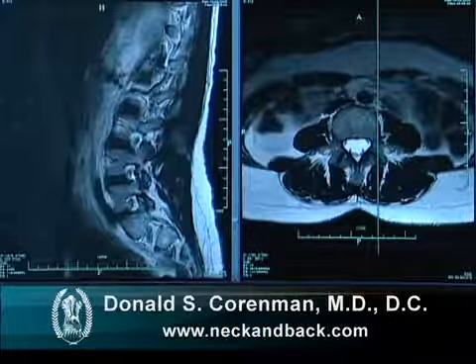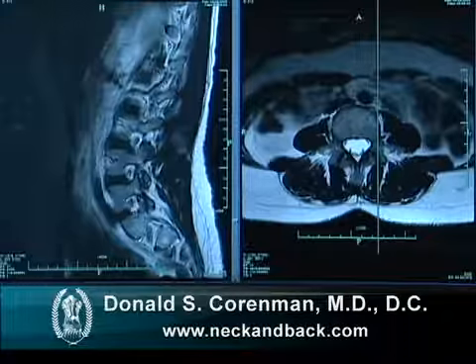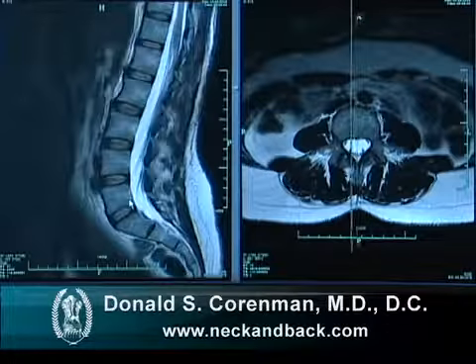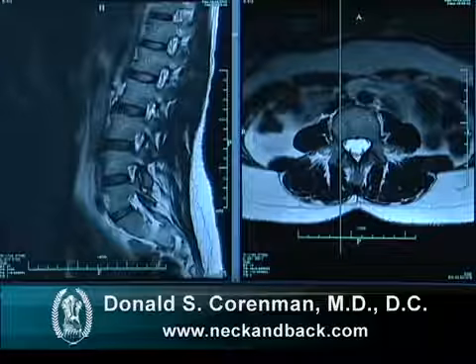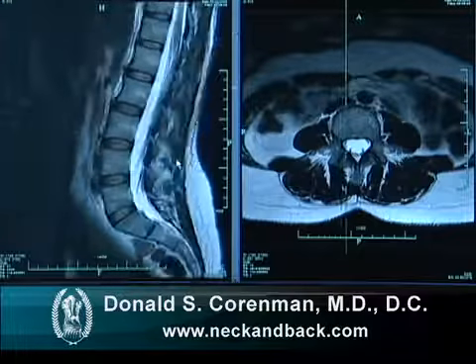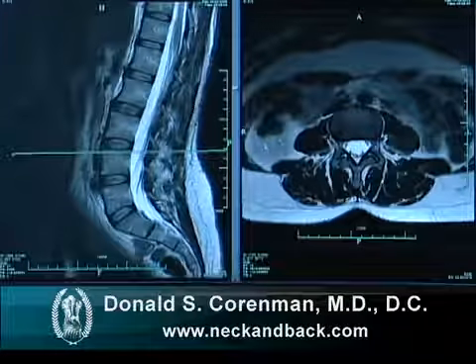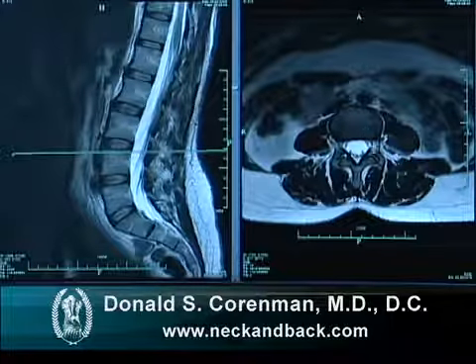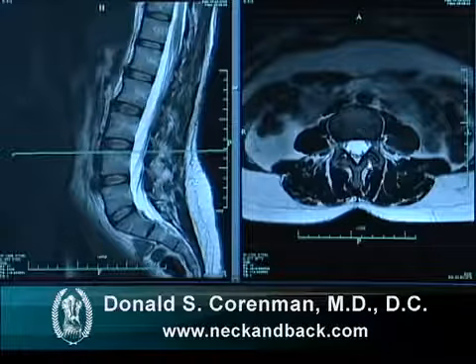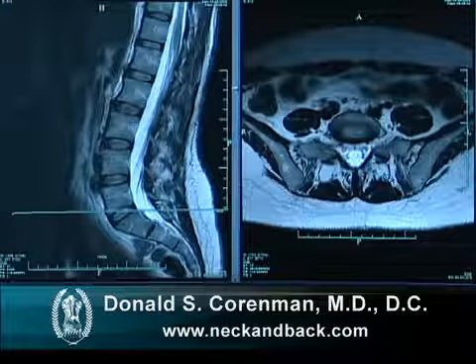Here is the 4-5 foramen with the L4 nerve sitting in its fat packing, and the L5-S1 foramen with the L5 nerve there. We can conversely go to the opposite side and see the exact same thing with the nerve roots exiting out the foramen. If we then go to the top-down view here, we can look at the angulation and cut of the spine and visualize the spine as what it would look like if you took a samurai sword and looked up at the spine from there. We're going to start at the L5-S1 disc.